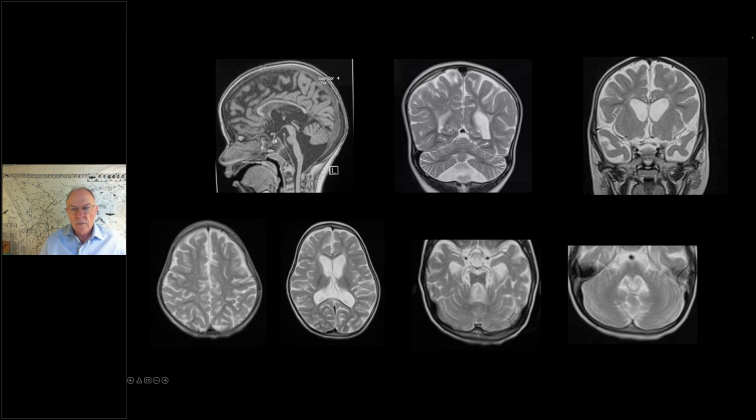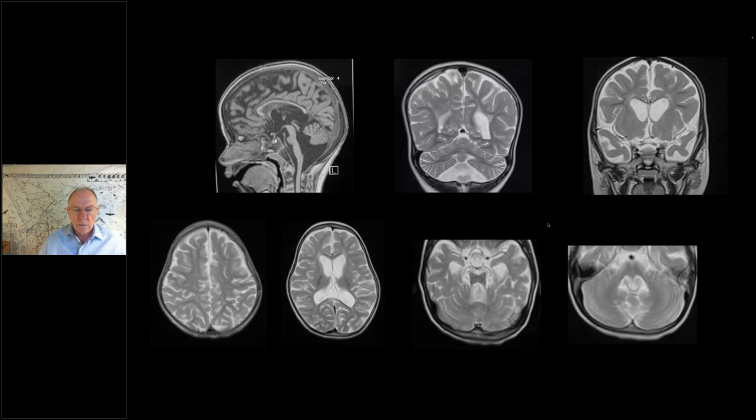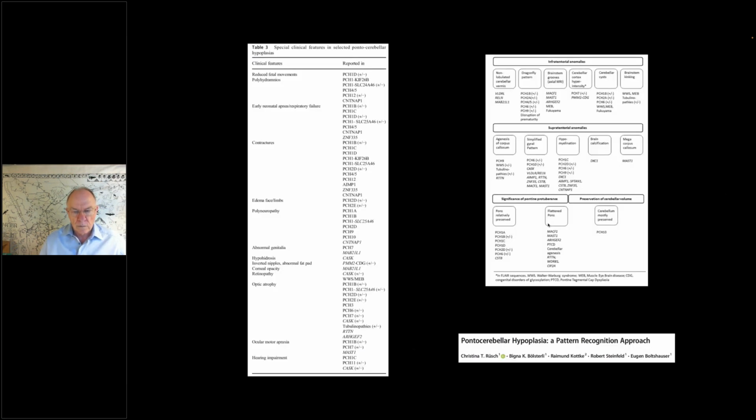There is reduction in the volume of the corpus callosum, generalized atrophy of the white matter and the parenchyma of the supratentorial brain parenchyma, as you can appreciate on the T2 axial sequences. I cannot appreciate any malformations per se, and no signal changes other than the atrophic brain. The finding, I would say, is non-specific. Some clinical clues and imaging clues can further help in narrowing the diagnosis.